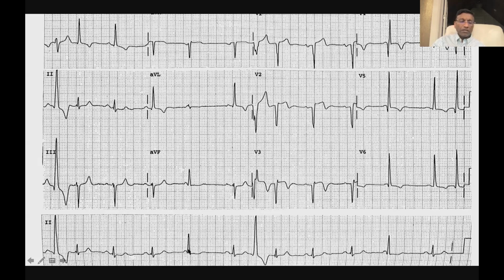But part of the ventricle is captured by this PVC focus, and part of it is captured by normal conduction, the fusion beat. And here the ventricle is not refractory, and conduction has been completed from top to bottom through the normal conduction system. And the ventricle finds itself available to be depolarized by this PVC. And so you get a full-blown PVC right there.